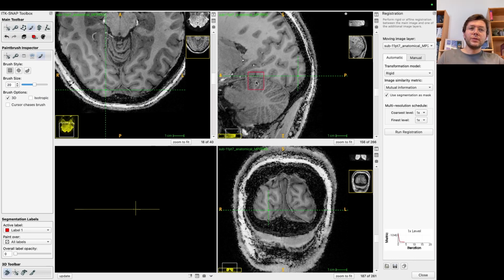So that's all for today. This is a short video. I am going to follow up maybe with other steps, depending on the other data that I receive, and hopefully establish a layer analysis pipeline for this really exciting 11.7 Tesla human fMRI data.